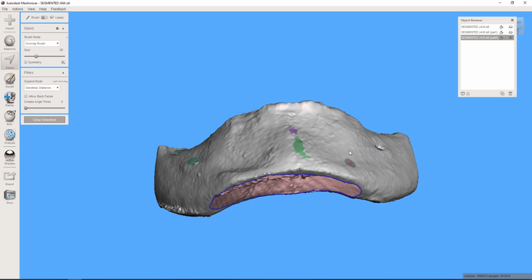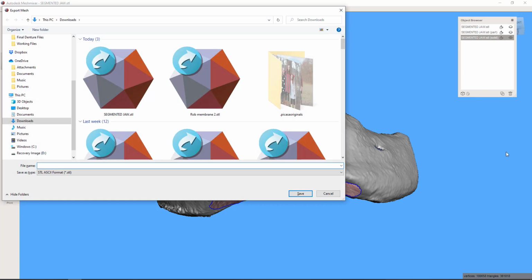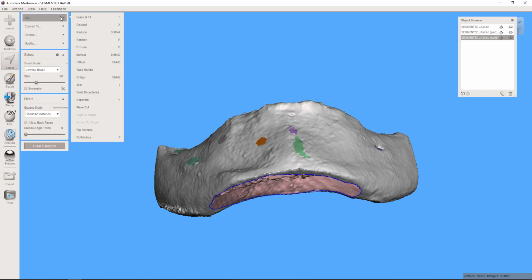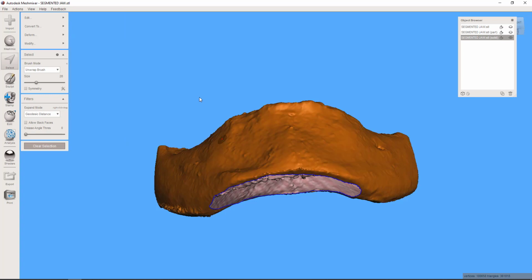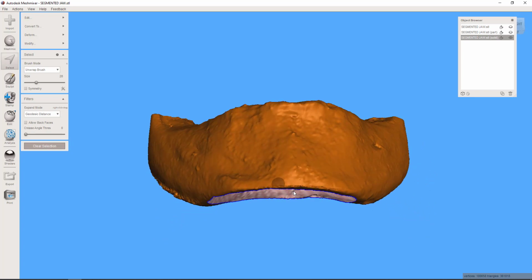Now how do I get rid of it? Well, what I can do is, again, I hope that I have detached all of the outer shell from all of the inner shell. So let's try. I'm going to click on this, which would be the outer shell, Control E, which is, oh no, that's not it. Let's see, is it Shift E? Control E. I'm having a mental breakdown here. Modify, expand to connect. Oh, it's just the E. Okay, sorry. If I'd have just hit the E and not Control E, it would have expanded this to everything connected, which again, I hope is that entire outer shell.